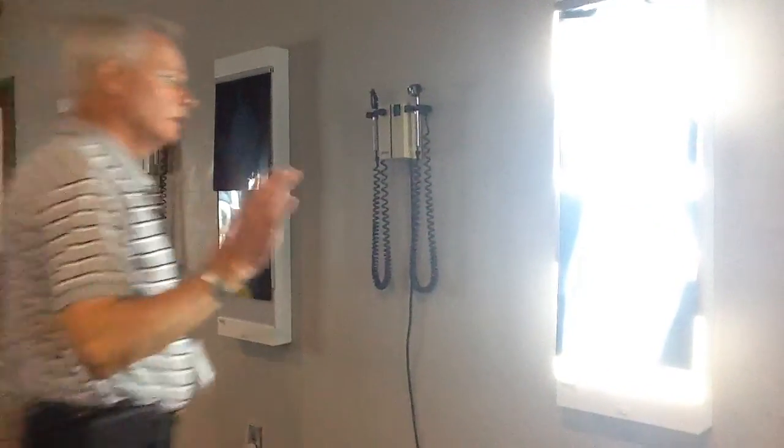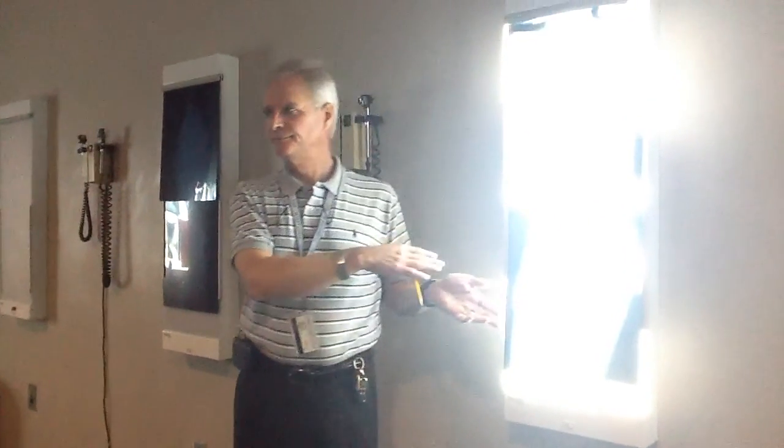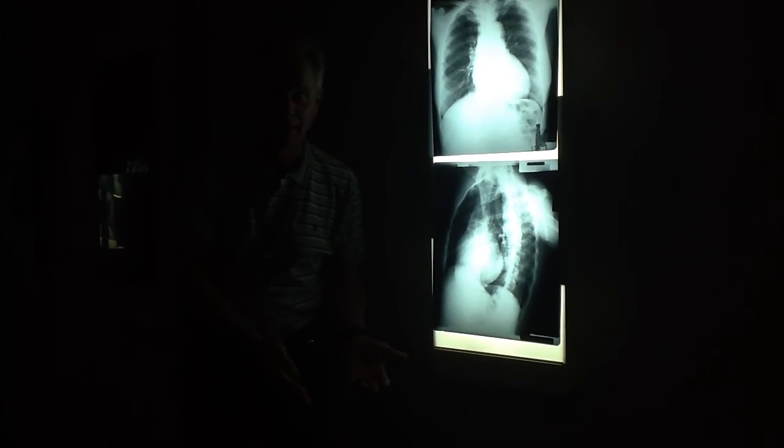But oblique views are kind of a lost art in radiology for the chest, because we have other imaging that will work better. Ultrasound, chest CT. Rather than doing this, it's like, why waste the radiation? We're going to go to CT anyway, let's just go to it. Or if it's the heart, we're going to go to echocardiography anyway, so let's just go to it and forget about these. So they're kind of like decubitus views. You know, they're good, but nobody does them anymore because we're going to go to CT anyway. So let's just bypass it and go right to the CT.